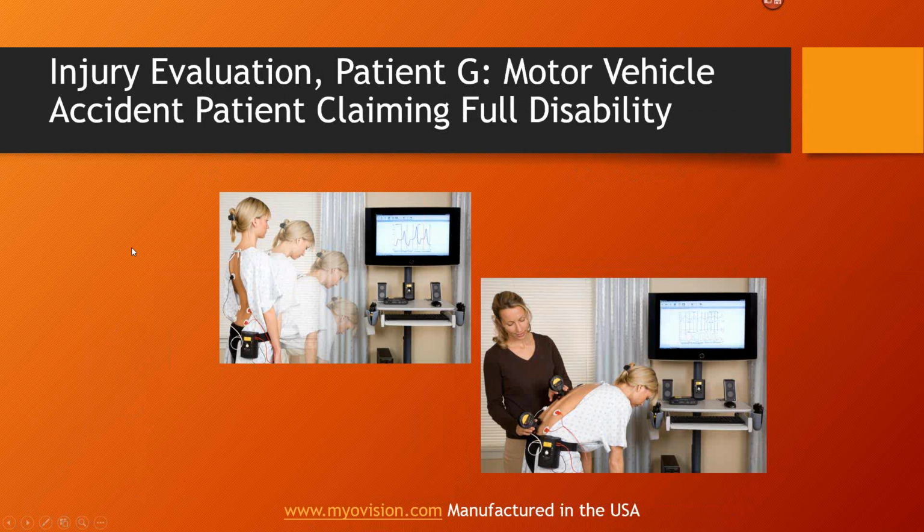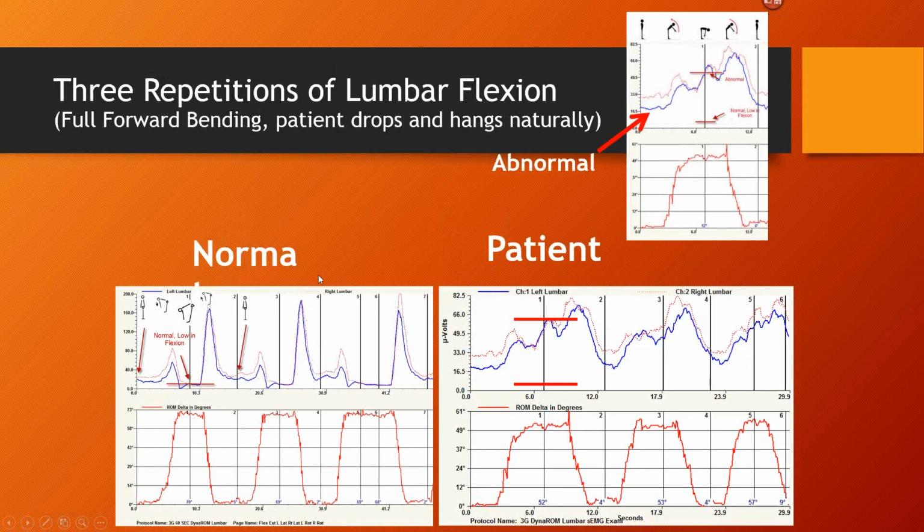I had one recently, a young woman who's in great shape physically, seemed to be happy, no issues at all, but was in a lot of pain, and her tolerance for pain was extremely high. And the graph, again, matched exactly what she was feeling. Here's the individual, normal, again, bending into flexion, muscles shut off in flexion. These are 3 in a row. Muscles shut off, left is blue, right is red, so range of motion. Here he is. You can see in full flexion, muscles fire like crazy. This is an injury.